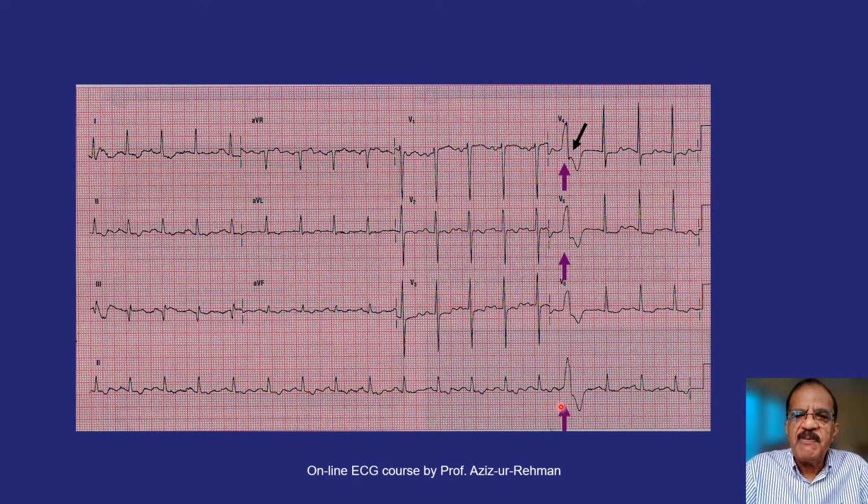The P wave was expected sometime later. What could this be? This little notch here, visible here, here and here, is actually a sinus P wave. Now this is actually a ventricular premature beat, as I will soon disclose and show you.